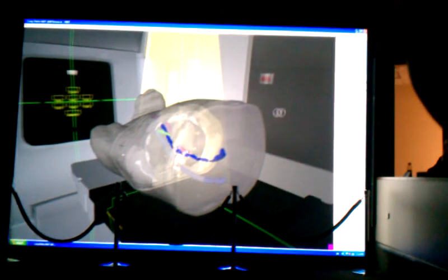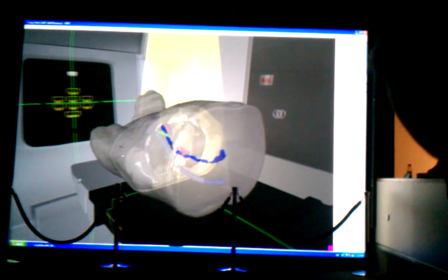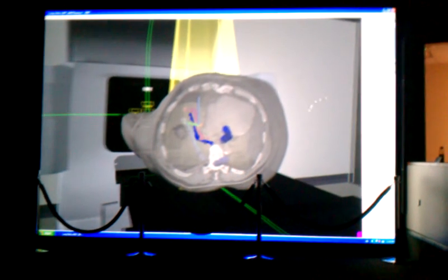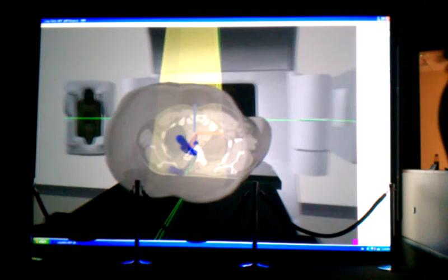Okay, so generally when I would use it for anatomy class, a lot of times I will refer to not just the structures in the body and where they're located, as far as where your trachea is located in comparison to where your esophagus is. You can see the spinal cord there going right through the vertebral foramina. You can see your esophagus line here and your trachea in relation to there. And then I kind of use that as a tool to show students on a CT also what different structures are and where they kind of lie on that structure.